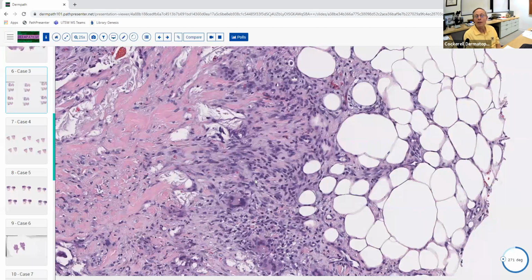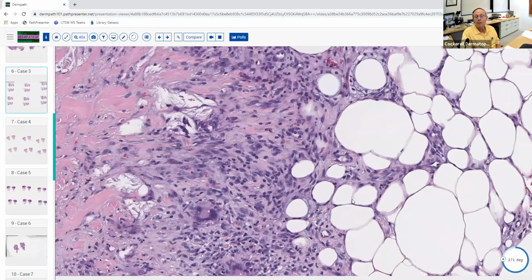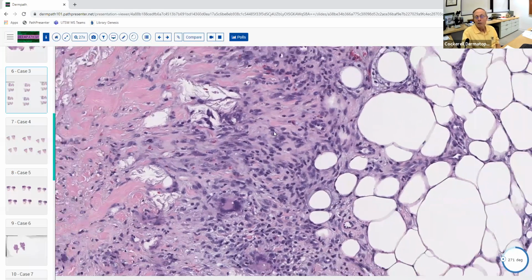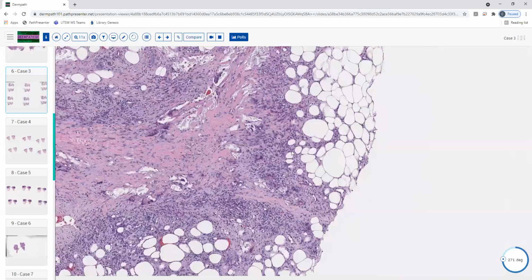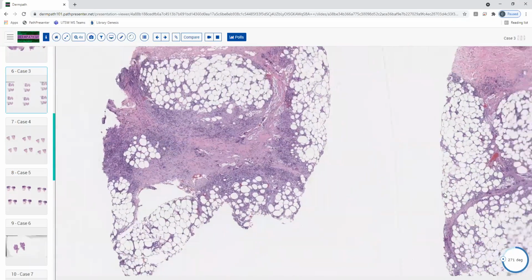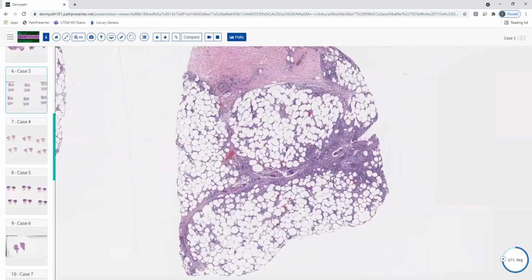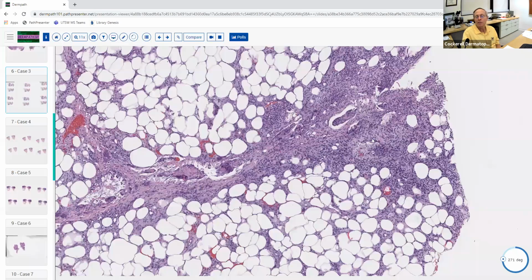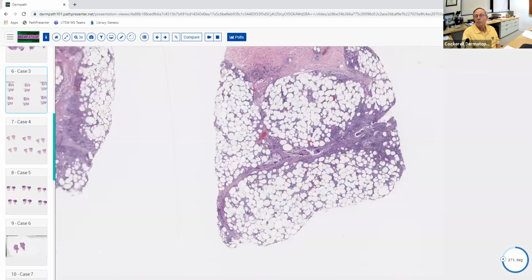But the most important thing is that it shows you this pattern that you're recognizing as a mostly septal panniculitis, with granulomatous inflammation and a mixed infiltrate too. There are actually a couple of eosinophils in here, which we see in this condition. So what's the diagnosis? The most common cause of septal panniculitis is EN, erythema nodosum. Yeah, this is a classic, beautiful, doesn't get better than this, erythema nodosum. So that's a beautiful example of it.